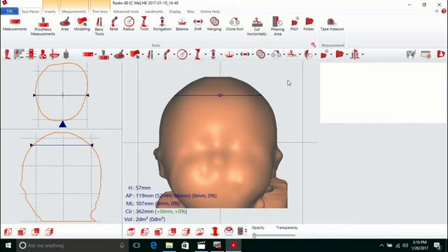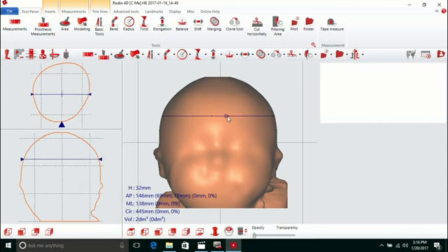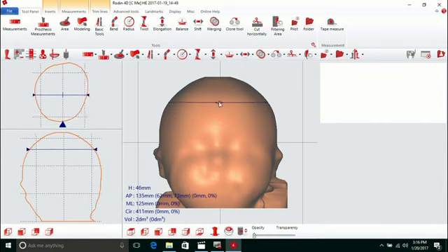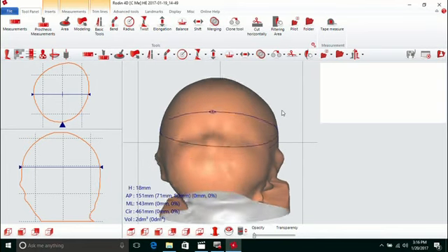Okay, now we're going to take a look at cranial reporting with Neo. Alright, with the cranial loaded onto the screen, you're going to set your cursor line at the desired location where you want to take your measurement from. So, left click on your mouse, hold down, you can see the cursor line moves with the cursor. Drop it at the location where you want to take your measurements. Always remember that that diamond indicates the anterior or the front side of the model.